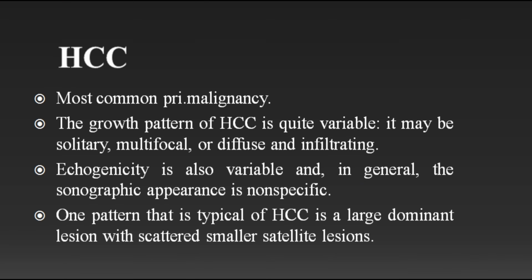Now, we are going to discuss hepatocellular carcinoma. What may be the sonographic features of hepatocellular carcinoma? The most common primary malignancy is hepatocellular carcinoma, and the growth pattern of hepatocellular carcinoma is quite variable. It may be solitary, multifocal, or diffuse and infiltrating. The echogenicity is also variable, and in general the sonographic appearance is non-specific.